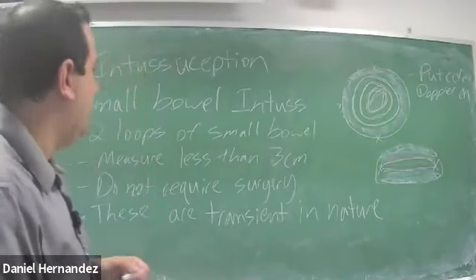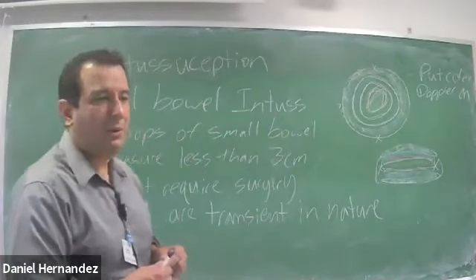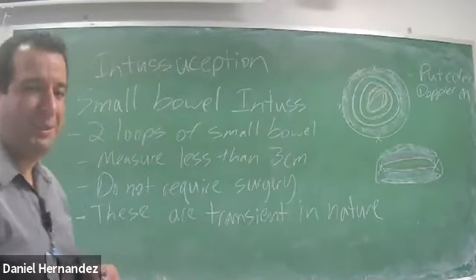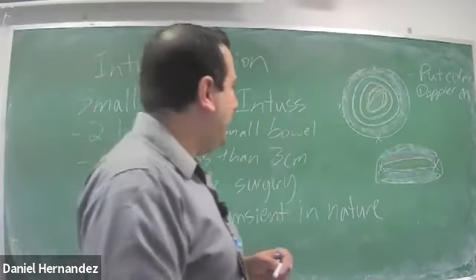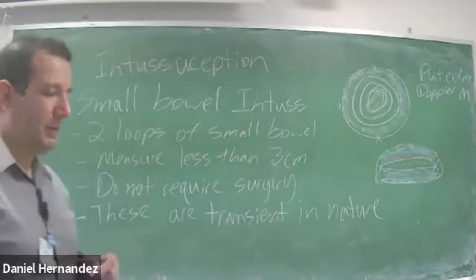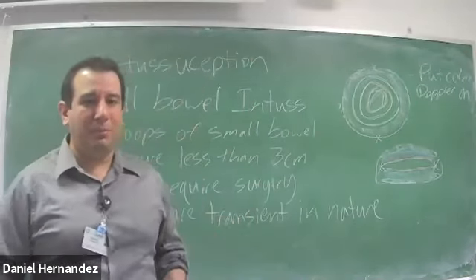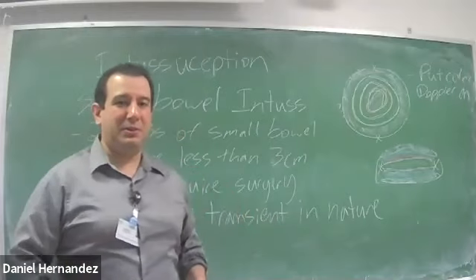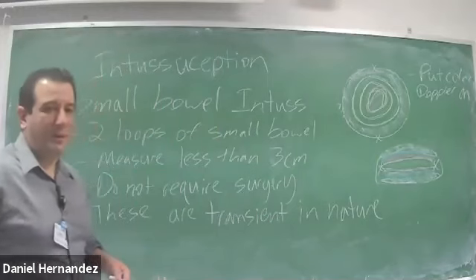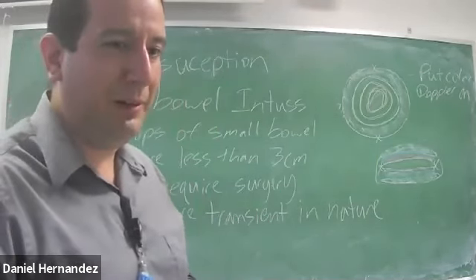But again, do not be afraid of these intussusception studies. It's actually quite easy, and the hardest thing is just dealing with the crying baby, to be honest, and trying to calm the parents down and keep the child still while you're getting these images. But again, it's just quadrants: sweeps, picture, picture, picture, sweep. Superior to inferior, lateral to medial, in each quadrant and midsections, and you move on.